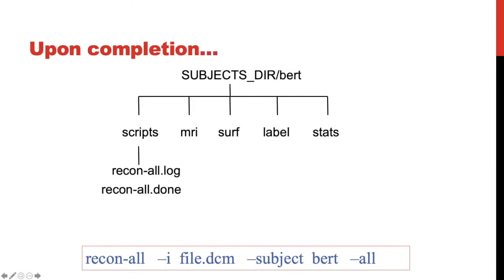So your scripts directory is going to have probably the most important document in there, the recon-all.log. And basically, this is going to tell you every command that FreeSurfer ran while it was doing recon-all. This is really important when your subject finishes. You're going to want to go in and check and make sure that it ends at the very bottom with "subject finished with no errors." And Ren will talk about that a bit more, but this is going to be really important once your subjects are finished going through the pipeline.